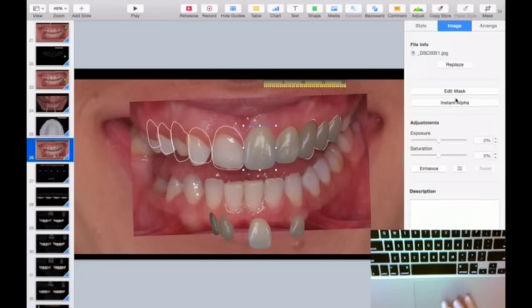to adjust this. I'm going to go to Image, Exposure, and I'll make it lighter. I'll do this in all of them. Also, what you can do here is saturation, make it more or less yellow. Make it a little less yellow.